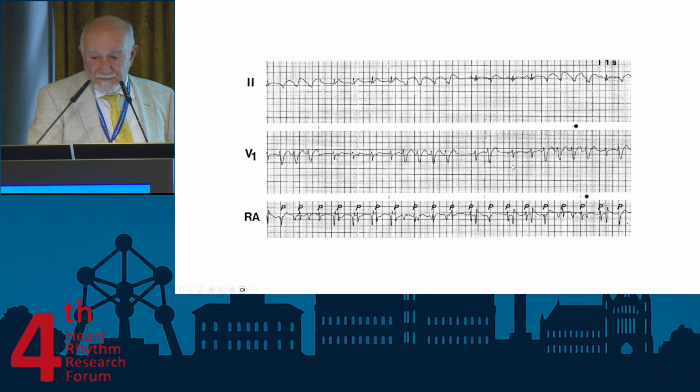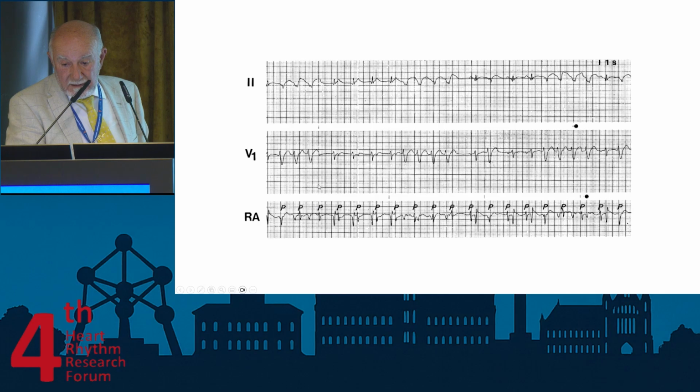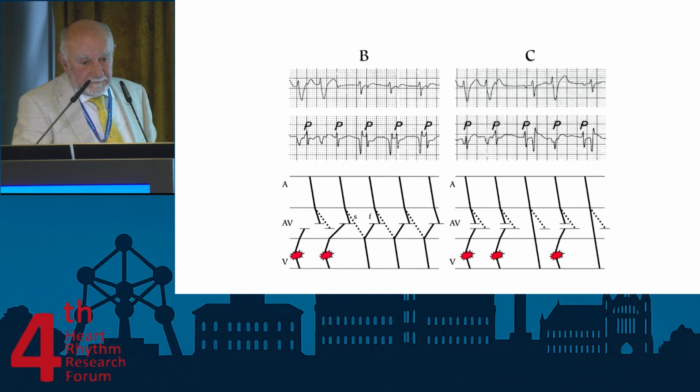So actually it's a patient with dual AV nodal pathways with sustained conduction over the slow pathway, this piece here in the middle. This is one-to-one conduction anterogradely over the slow pathway that is reset after the non-sustained VT, again a sinus beat, and then it goes normally, and that's it. So that's dual AV nodal pathways and non-sustained VT, in a patient during an acute myocardial infarction.